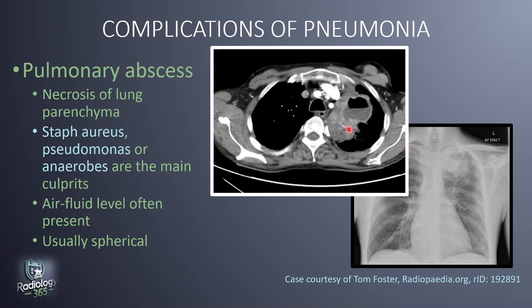And this is an axial CT scan of the same patient, and it showed a large cavitating cystic mass with air fluid level in the left upper lobe, surrounded by some consolidated lung parenchyma. The mass also showed enhancing lobular contours consistent with a lung abscess.